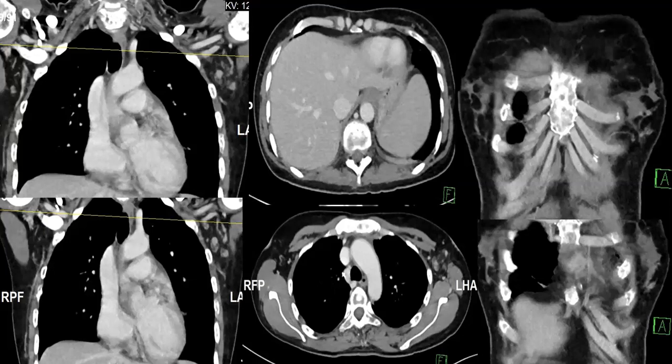Full axillary lymph nodes. The left axillary lymph node positive. Okay. I don't know, but maybe in the first image, in the right side of the screen, in the first row, I think there is a left breast mass. Excellent, well done. Yes, there is a lesion here.